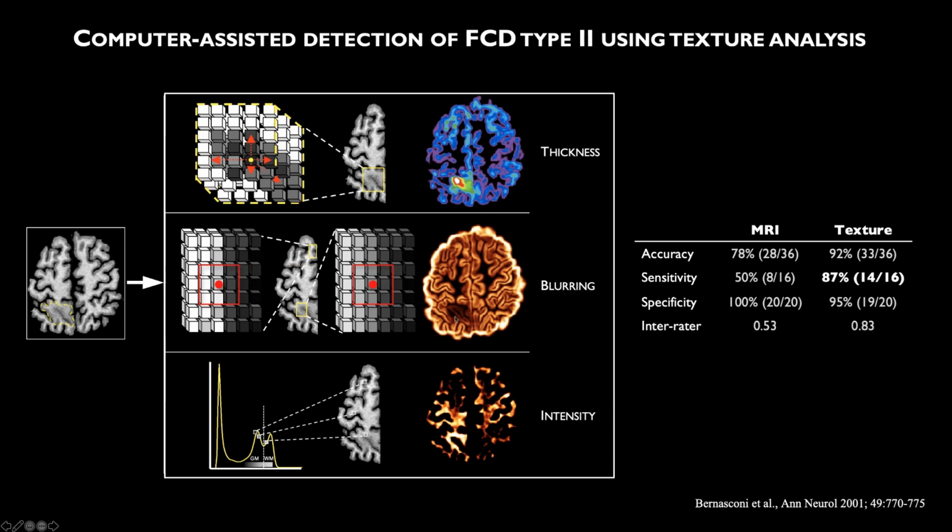To model the blurring between the gray matter and white matter, the absolute gradient of gray level intensities was calculated in a cube centered on each voxel. In the region of normal transition between gray matter and white matter, the gradient is expected to be steep. In regions of gray and white matter blurring, the gradient is less steep, thus blurring on the gradient map appears dark.